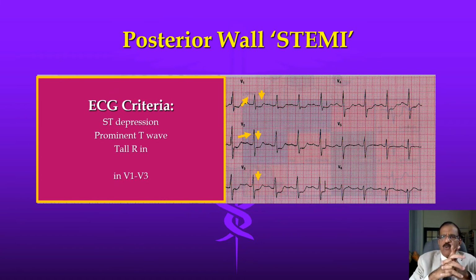I hope you were able to understand this one. It's a little tricky, but if you know the basic concept, I think you should be able to understand this ECG also.